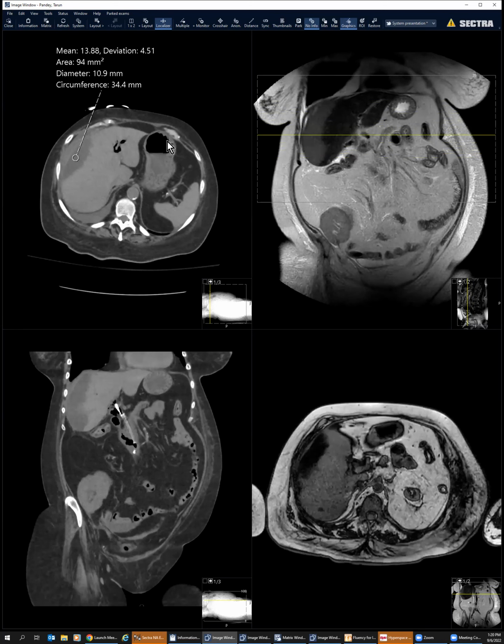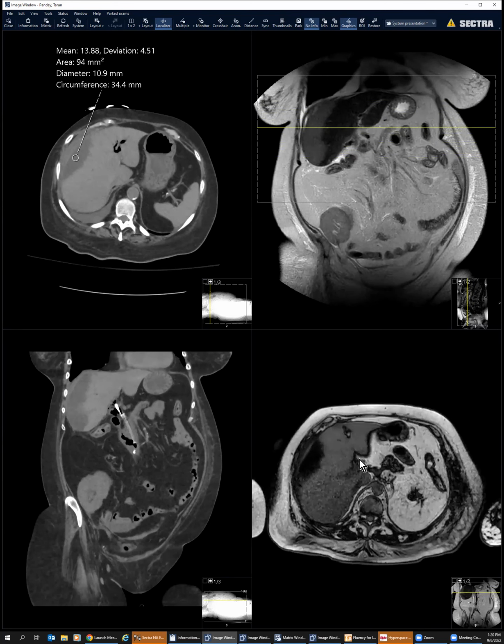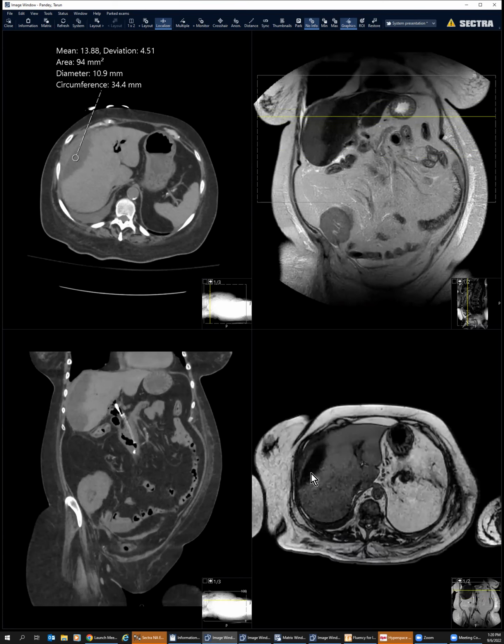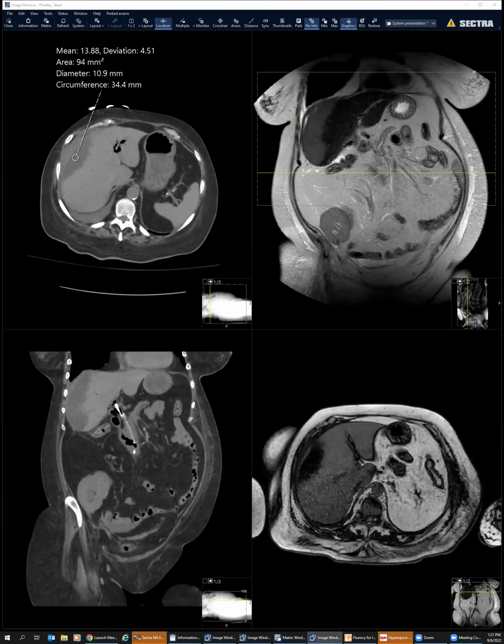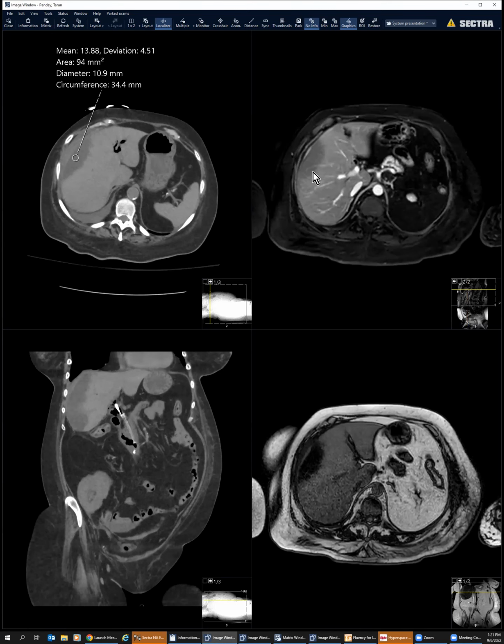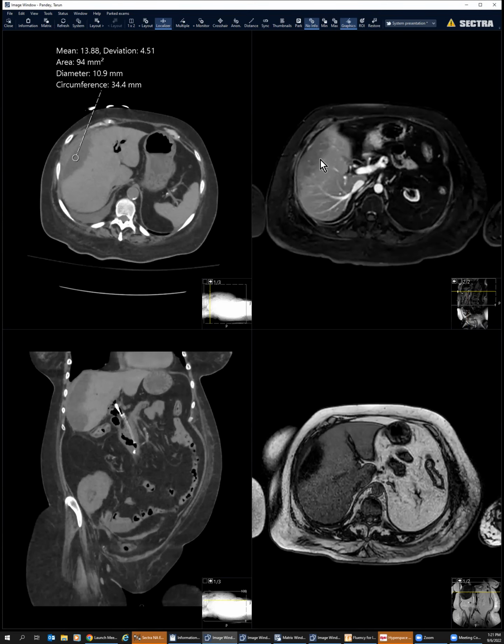The T2 signal of the liver is really hypointense. I think she's in renal failure. Maybe it's just iron deposition. Yes. Yeah, I remember looking at this case also. I think retrospectively the margins were jagged. For some reason, we could not give contrast for the CT, but on MR we were able to give the contrast. Let me show you the post contrast on this. So you can actually see the vessels coursing through that.